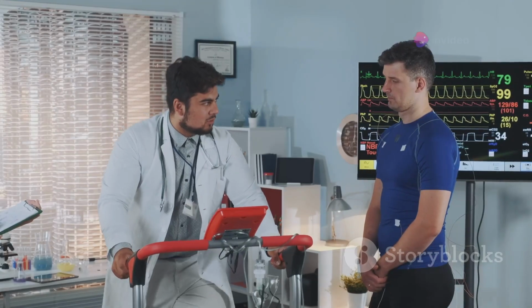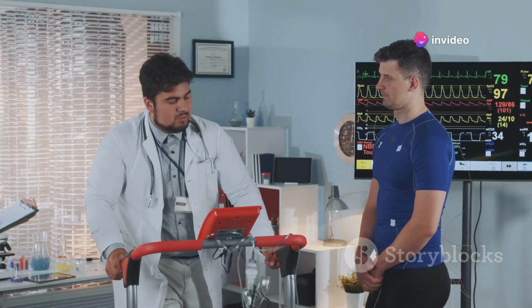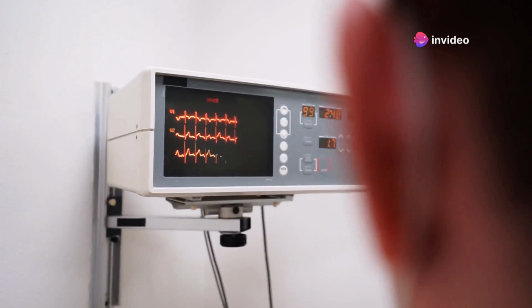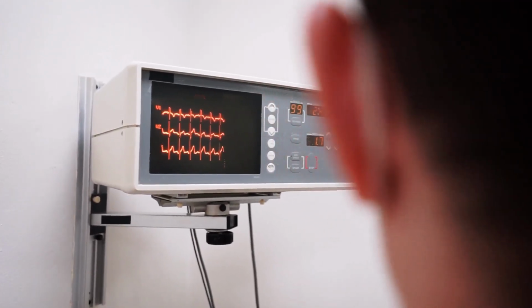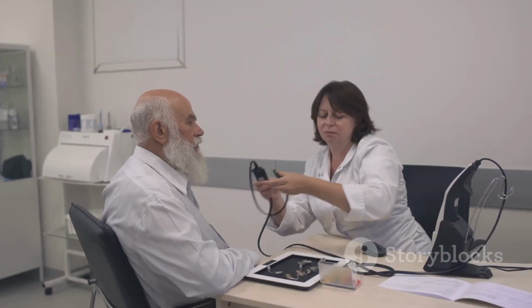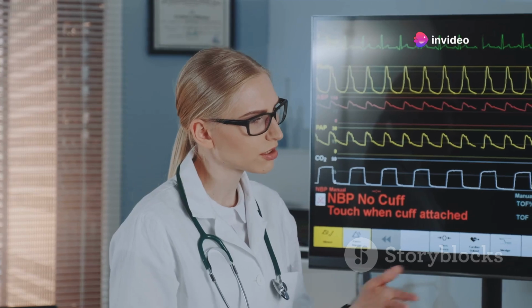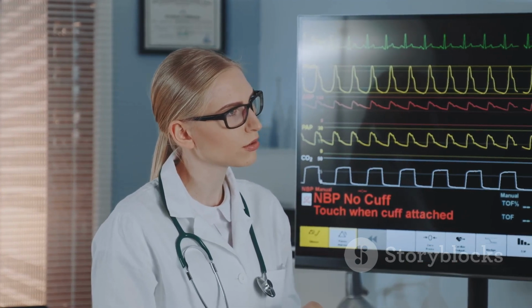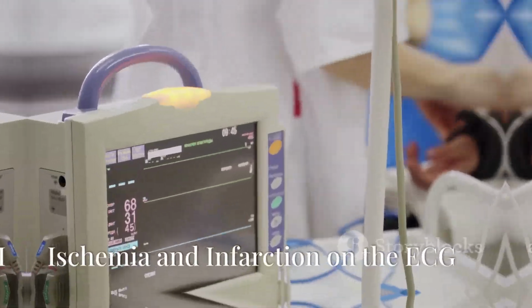Bundle branch blocks are classified as right bundle branch block or left bundle branch block, depending on which branch is affected. On the ECG, bundle branch blocks are characterized by a widened QRS complex. While some bundle branch blocks are benign and do not require treatment, others may indicate underlying heart disease. The ECG, in conjunction with other diagnostic tests, helps cardiologists determine the cause and significance of bundle branch blocks.